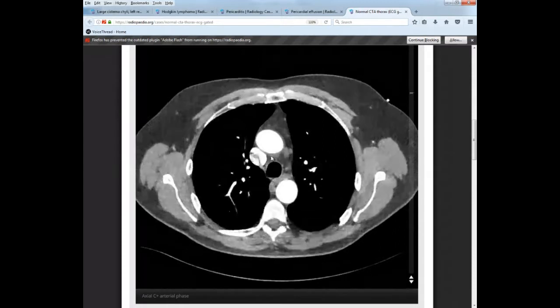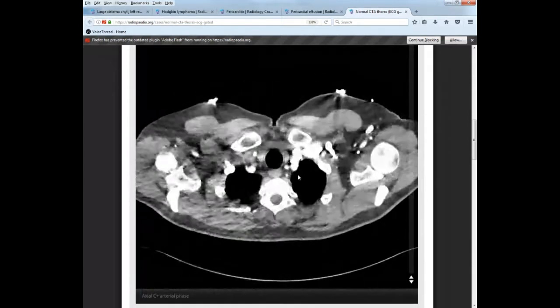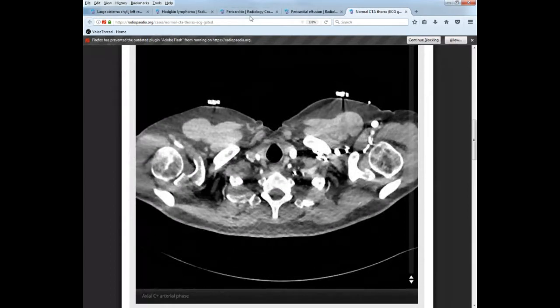Okay. Next thing we'll talk about is the trachea and the esophagus. So I'll go up on this scan. And again, just like any other scan, these 5 scans are in the course located under Research Helpful Links under Module 5. So go through these and scroll through, and just like I'm doing now, so that you can visualize and see the anatomy.